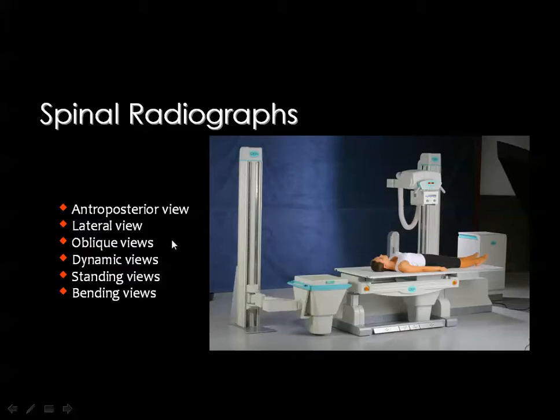Not all these views are performed for every segment of the spine, but there are basic radiographs.